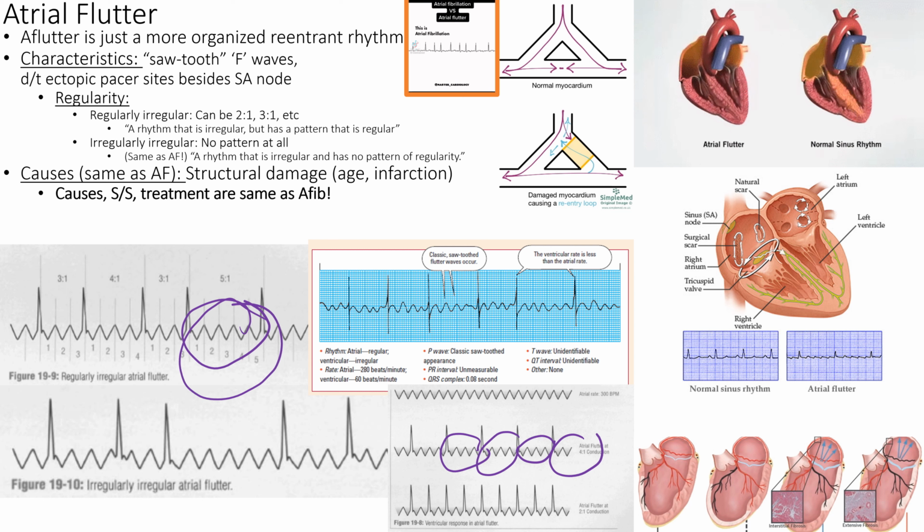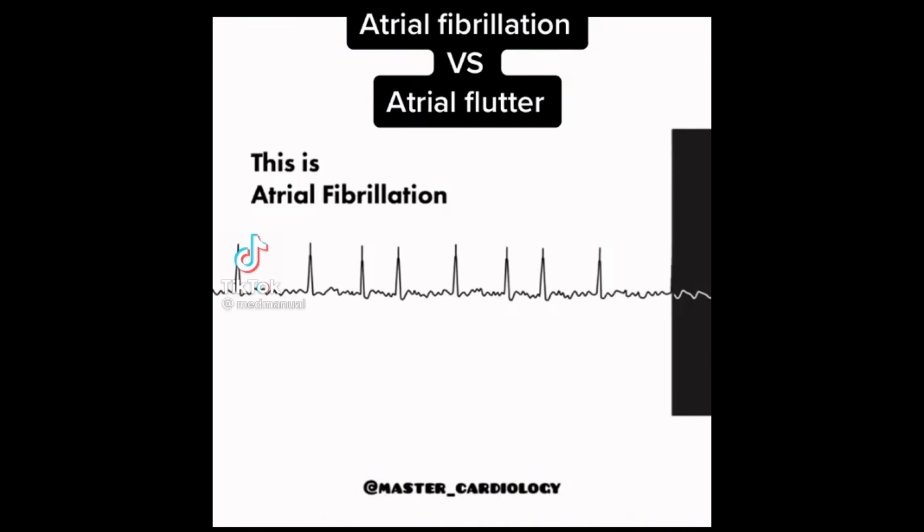Don't worry. The causes are the same, so it's nice when you're doing a table right here. Ditto. The only difference is I have F waves. I have flutter, so you have to recognize that's a flutter. Why are there so many P waves there? Those aren't P waves. Those are flutter waves. How do I know? It has a more sawtooth, teeth-like appearance, compared to a regular P wave, which is nice, upright, and rounded. So that's a flutter, and this is an example of differentiating them. If you have to play this video 12 times, I won't judge you.